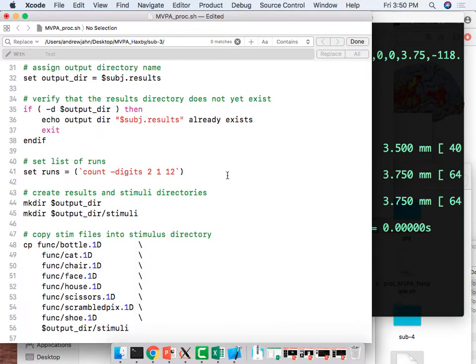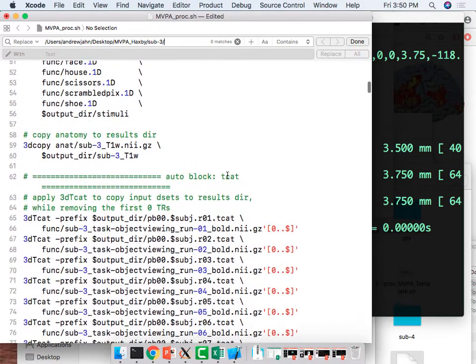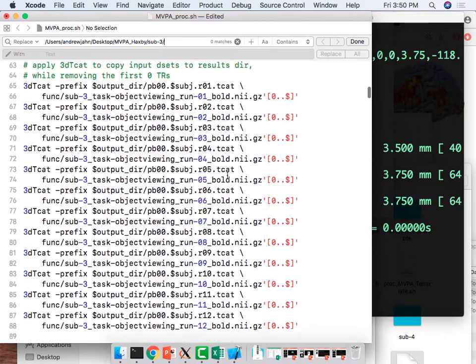What? Oh, I just removed, I'm just trying to make it so you can run it locally. It has some hard-coded paths in there that would throw an error for you. Yeah, so if you run this from the sub3 directory, you should be fine.